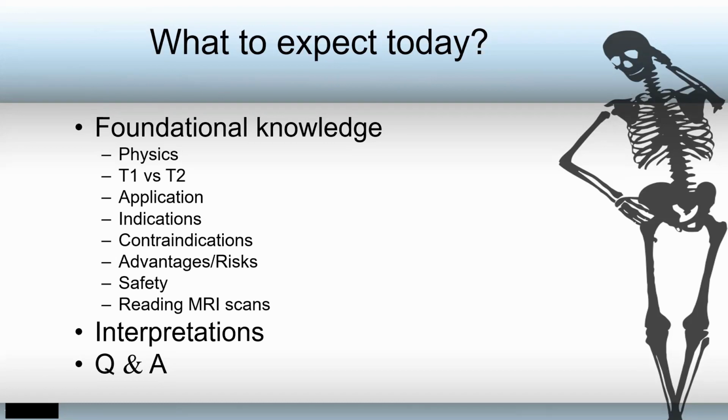So these 3 or 4 ligaments, cartilages and non-contractile structures, if you want to look at them, particularly in the knee joint, then only do you need an MRI. But normally you don't expect an MRI of the hip, knee, or even the foot and ankle joint, right? So our talk will mostly cover the spine as a whole and the shoulder joint. I will touch very briefly on the hip joint, and understanding the hip joint is very similar to understanding the knee joint, because the similar things that you see in the hip on MRI, relatively speaking, you will come across in the knee joint too.